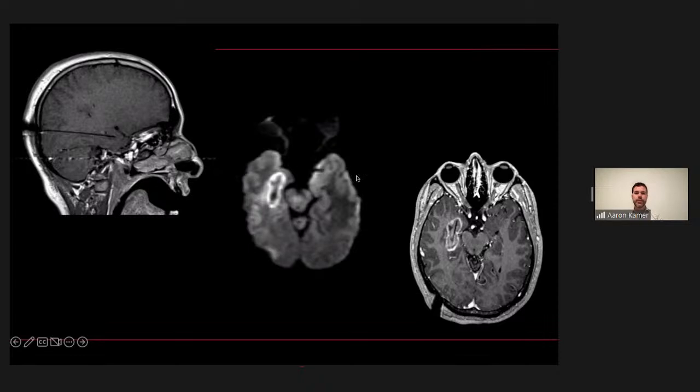Diffusion-weighted imaging for these patients is often done intraoperatively. That is, the patient has some ablation performed, and then some imaging is done, more ablation is performed, more imaging is done, in order to make sure that they're doing the ablation in exactly the right area and avoiding complications. So usually the diffusion images will show some restricted diffusion in the rim of the ablation cavity. You'll also see some avid enhancement in the rim of the ablation, and often some T1 hyperintense blood products as the coagulation happens in the region of ablation.